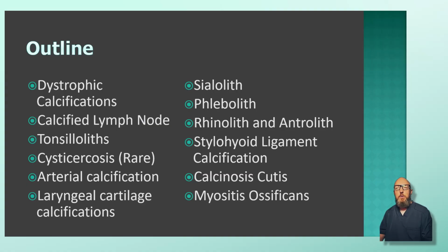So 2 of these carry real consequences, the carotid atheroma and Monckeberg's calcification. They need to be referred to a physician. Then a Phlebolith as well means a possible venous malformation, and so that probably requires a follow-up with their physician as well. So everything else in the video is basically an incidental finding, and just describe it as accurately as you can. Come up with that differential diagnosis. You'll probably be able to recognize what most of these calcifications are.